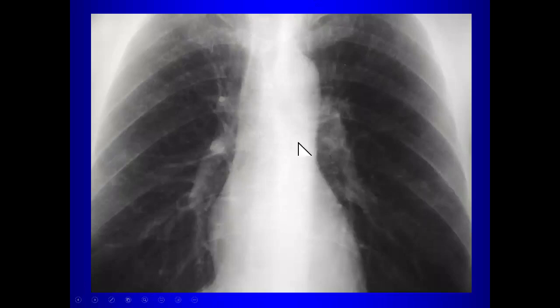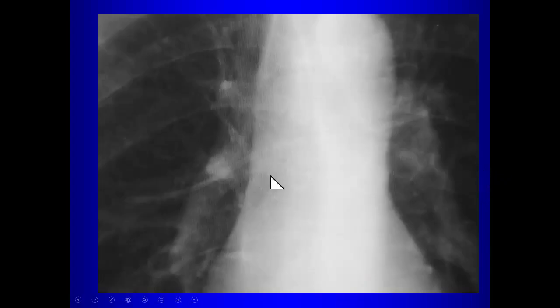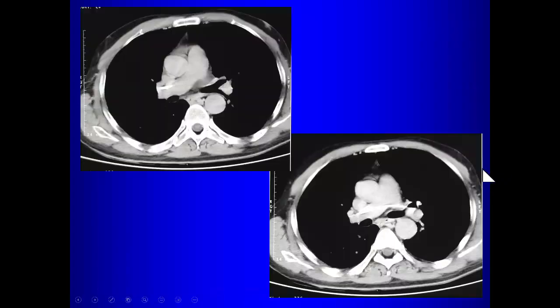Okay? So here's another case, a central venous line that broke. This fragment embolized to the bifurcation of the pulmonary artery. That's actually across the bifurcation of the pulmonary artery, a saddle embolism from a catheter fragment. So here it is on the CT going across the pulmonary artery bifurcation. So never pull a catheter back over a needle because you can shear the tip. And also when you remove these central lines, make sure that the catheter is completely intact, because if a part of the catheter is broken off, you may find it out there within the pulmonary artery.